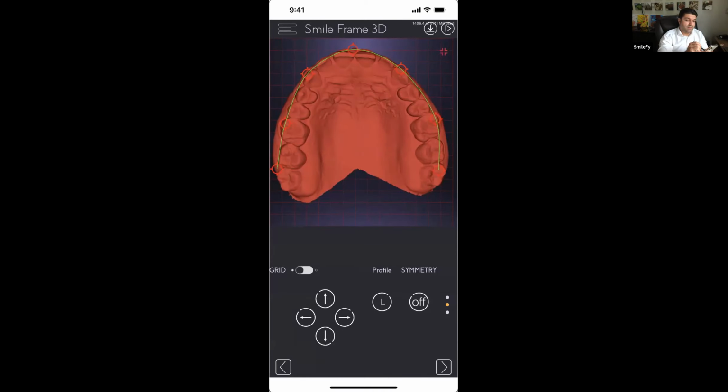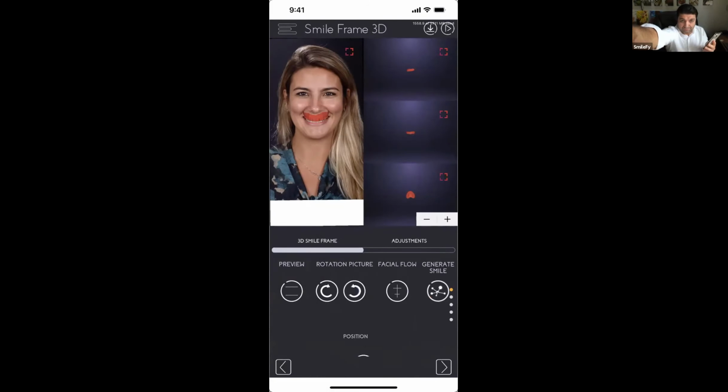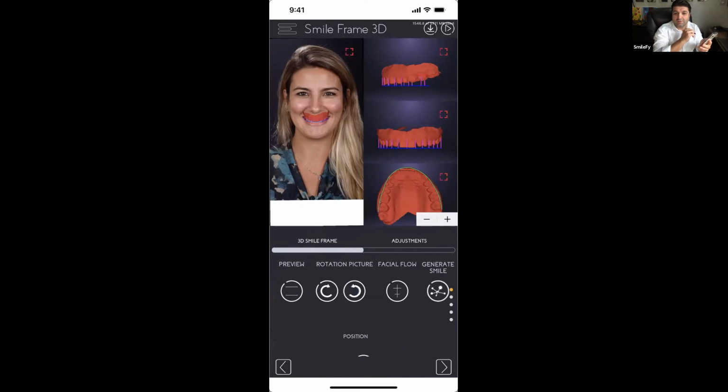Okay, so I'm happy or not? Let me bring this part a little bit more like this. Okay, I think that's good. Let's go to the next screen. Now, the next screen is, what do we work in the next screen? First of all, I'm gonna zoom into my views, but this is gonna be fixed. So you're gonna get something like this, right? When we go live.